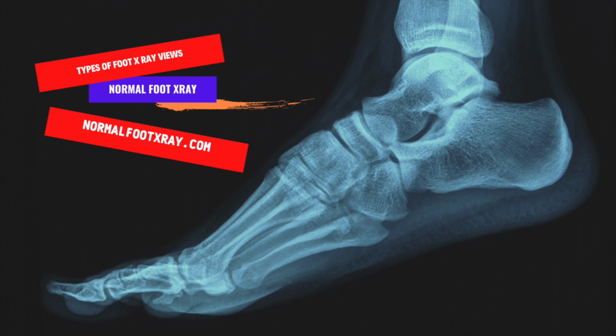Usually, the X-ray is taken by an X-ray technician, usually in a hospital or healthcare provider's office. During the procedure, the foot X-ray is captured in 3 different angles. After the pictures are captured, the doctors will analyze the information and decide on the best treatment. A typical foot X-ray will show 2 views.